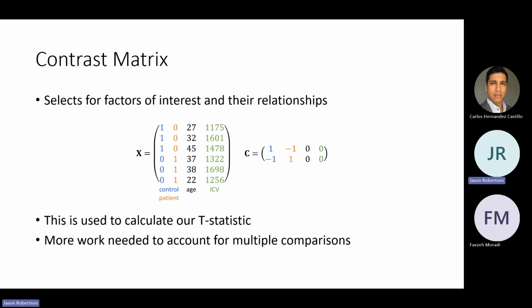Yeah, so what SPM uses is family-wise error correction, which is an application of random field theory, which basically allows you to find related clumps of data together, and sort of finds a way to split the difference between just looking at a raw p-value and looking at something overcorrected like a Bonferroni would be in this case. And we'll see, and I can maybe point to some of the stuff in the outputs once we get there.